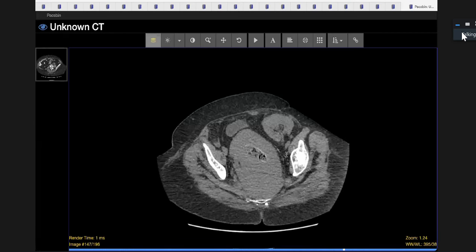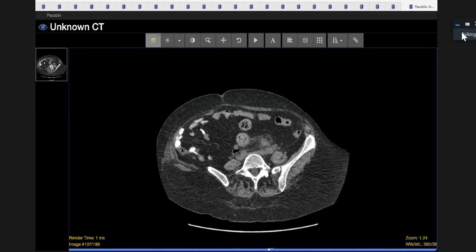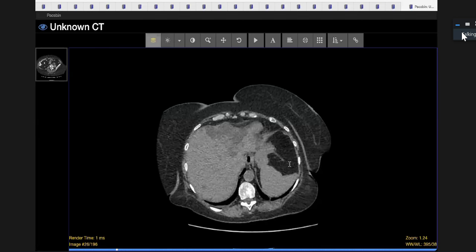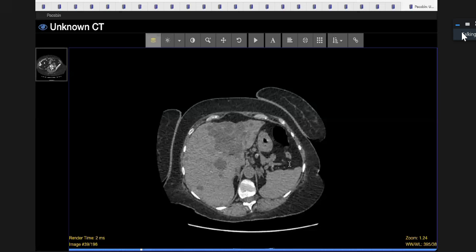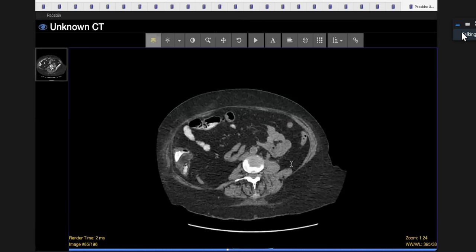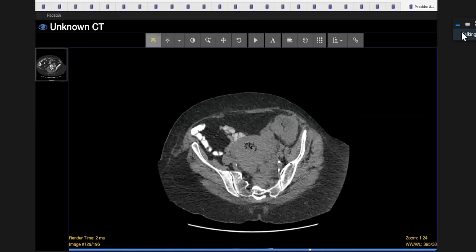Excellent. What about the liver? That's the only thing you've not mentioned. That's the cysts in the liver because of the polycystic kidney disease. Yes. Have you seen this case before? No. Excellent then. Sometimes when I teach on radiology masters, I use this case because it's one of my favorites. You did an excellent job, because I've not really had to prompt or guide you. This is an example of a case in which there are many findings, and that can be quite overwhelming, but they're actually all connected, and you worked it out.